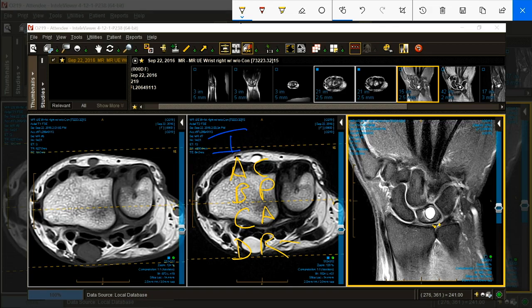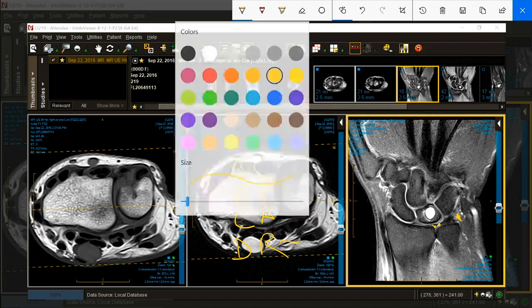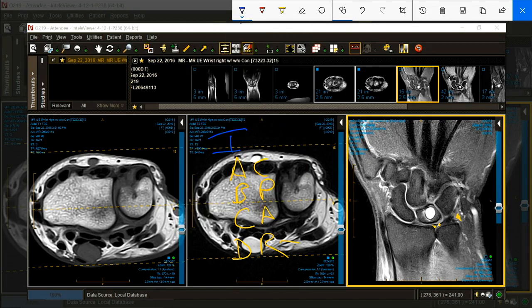Call it a central perforation or fenestration. That is 90% of all traumatic tears of the TFC, maybe 80. The other 15, peripheral attachment tears. And then the others are very rare. We also have another grading system for chronic tears. That's called Palmer 2.